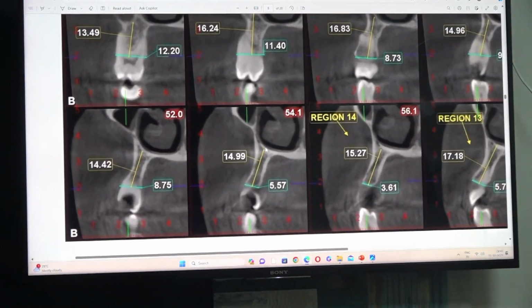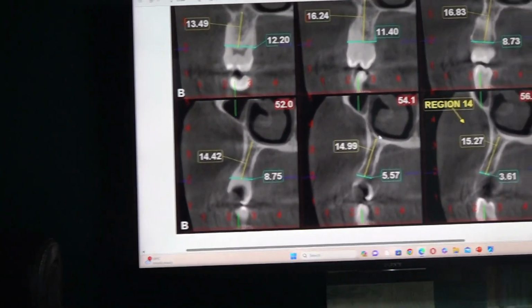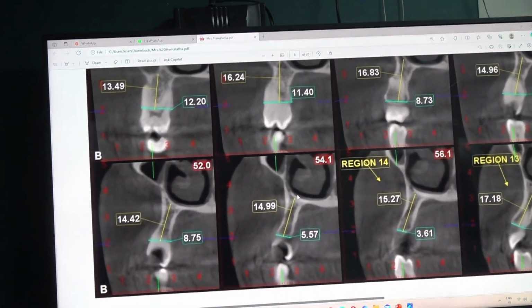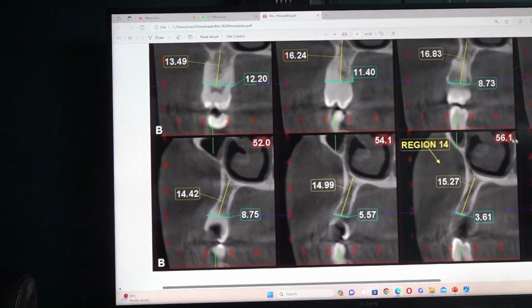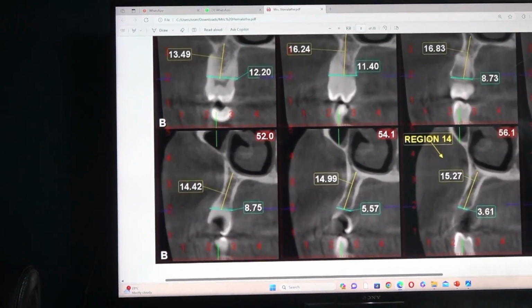Okay, they have not included the nasal floor. You will go 1 mm into the nasal floor also. So definitely 3.75 into 16 will work. That too, if you tilt mesially, the length will increase actually. You may go for 18 also, but I will stick to 16, that is enough. So 3.75, 16 compressive for 1/4.